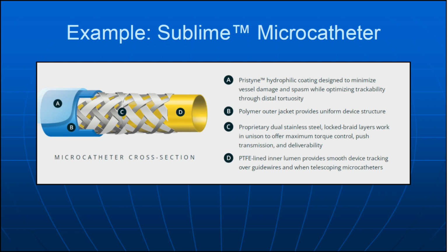In most cases, this material is a Pebax or nylon material, or may vary along the length of the microcatheter. The summary lists that the outermost layer is a hydrophilic coating material. This coating is typically so thin that it does not impact the mechanical performance of the device, and so it is neglected when modeling the device in the CathCAD software.